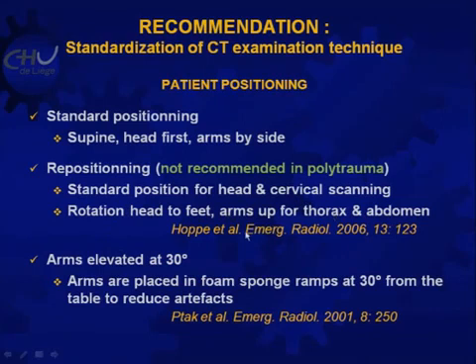One little nuance. If you elevate the arms, the patient being in a supine position, to 30 degrees and you fix the arms in that position, that will get rid of most of the artifacts. This is a very nice, very simple procedure to get fewer artifacts, despite the patient staying in a supine position. The next question concerning standardization is oral contrast.